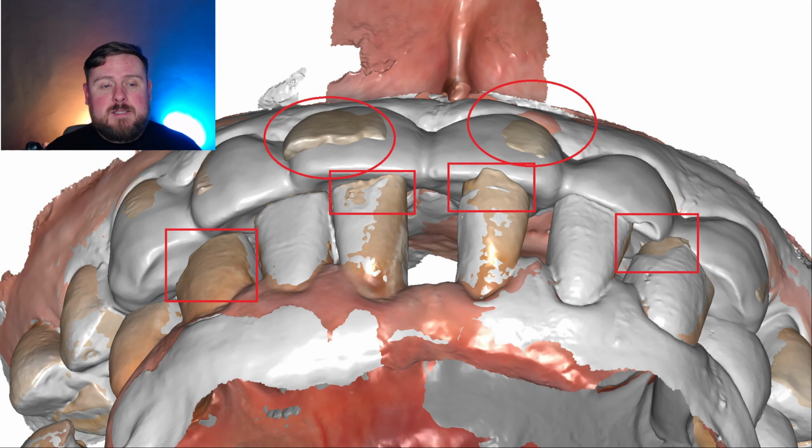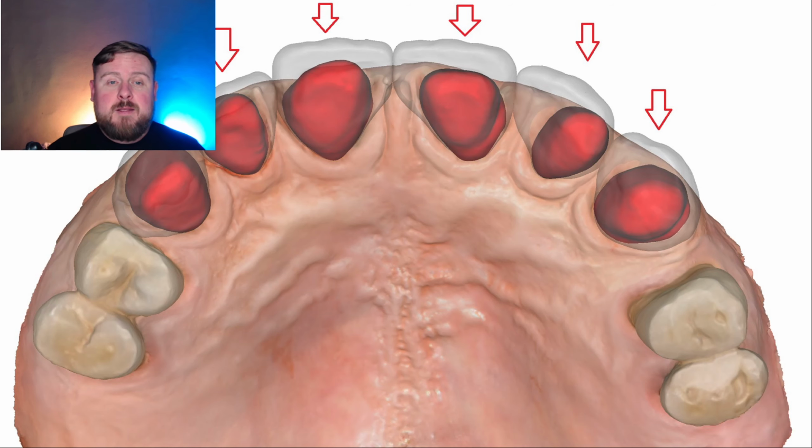For the guidance, as you can see, on the lower jaw, on the last scan together with the mock-up, we have some parts of the lower teeth already removed. You can check. Those lower jaw scans are different. Use the newest scan. As you can see, upper jaw teeth are already prepared.